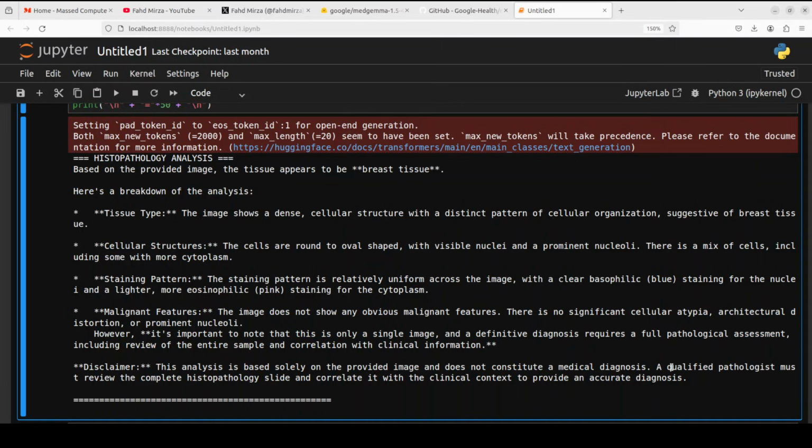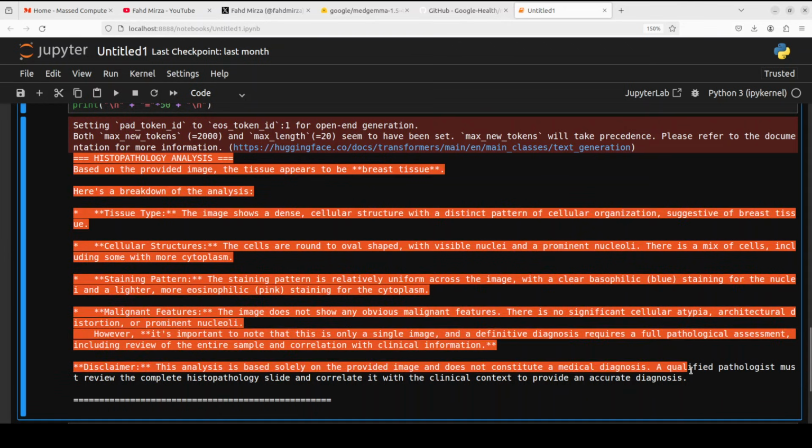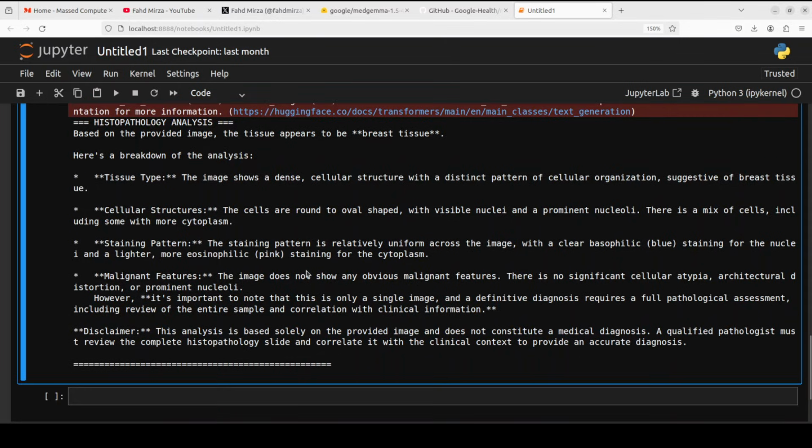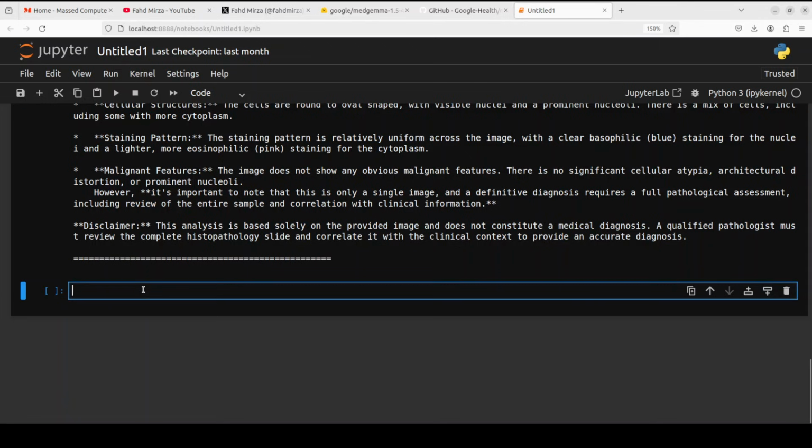But I think if you are a medical practitioner, this is going to be huge. It is going to really augment your work. I always wanted to be a doctor, but look, I think with the help of these, a doctor can really lift the game. Cool. And then it could become universal. Anyway, so let's check out another one.